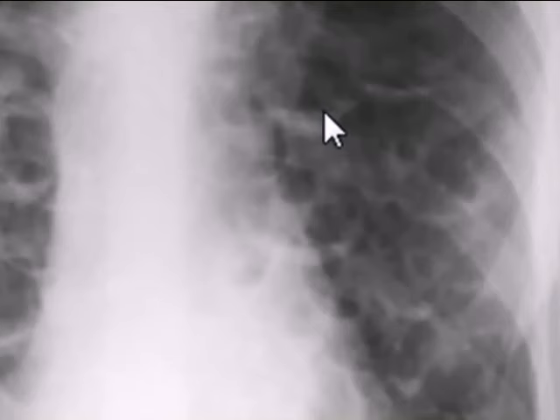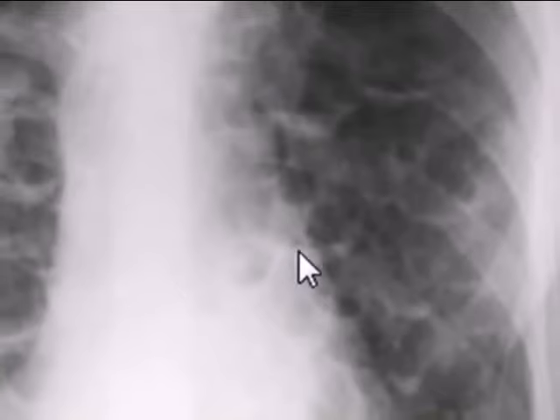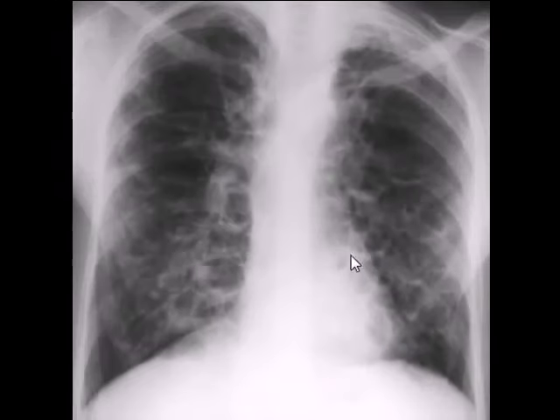Some of these cysts, such as this one, appear to have crescent opaque inferior borders. The rest of such cavities above this crescent border, you have an air density, so rest of the cavities are filled with air. Now these cysts are actually dilated bronchi rather than anything else. The condition, if not confined to limited areas of lungs, can be deadly and is known as bronchiectasis.